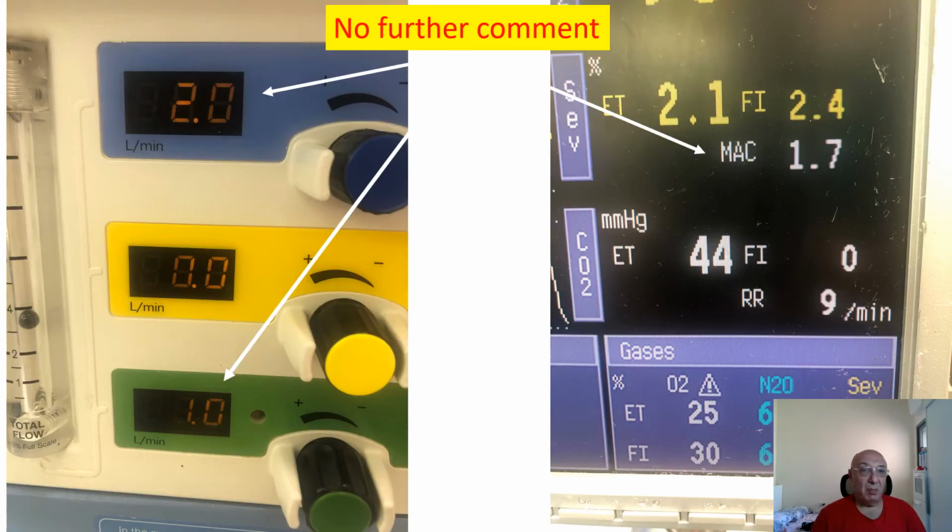And because I'm a very bad guy, I made a picture with the flow of one of my colleagues. It was in the middle of a long surgery. These are the flows used, and this is the consumption. Now you imagine the gas consumption in this case. But basically, in many places, I saw people using for 1 hour of surgery 10, 15, sometimes even 20 mils of sevoflurane liquid, and nobody cares about that.